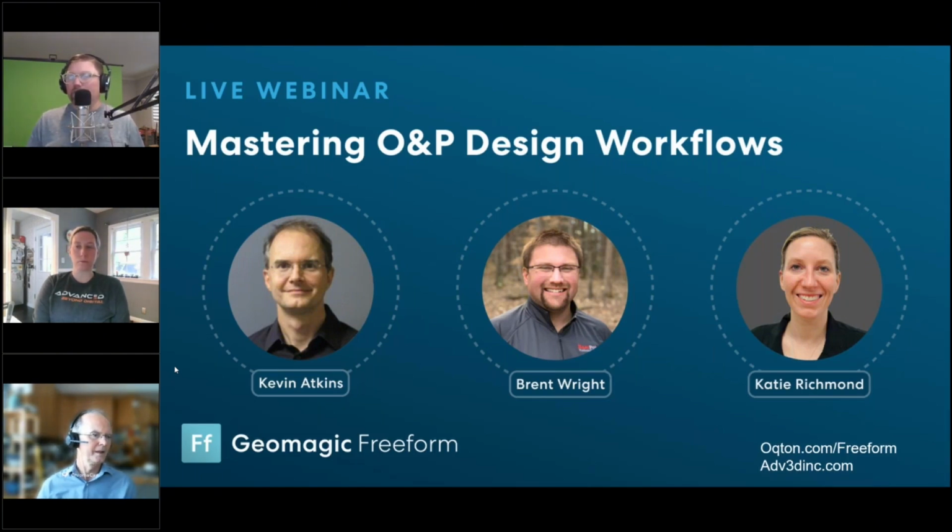in Freeform. So is that in Freeform and Freeform Plus? The auto surfacing, Freeform Plus, yeah. Okay. I think it might be in Freeform as well. I should double check that. Definitely in Plus. But all the solids tools, because you can make solids like regular CAD solids, that's definitely Freeform Plus.